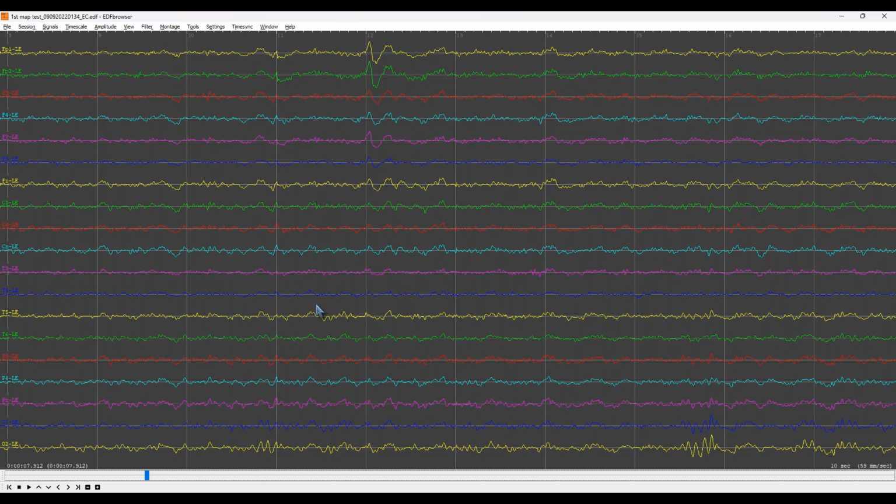based off the type of artifact we're seeing, whether it's, like I said, that short burst, if it's showing up more like a delta signal, or if it's more of that contracted muscle tension where you get that high amplitude compressed signal. That kind of narrows it down. Or if we see a very repetitive pattern in a beta frequency, that's generally coming from electrical sources, just the way our low and high pass filters overlap. The signal that we would see is around a 15 hertz signal with electrical artifacts.